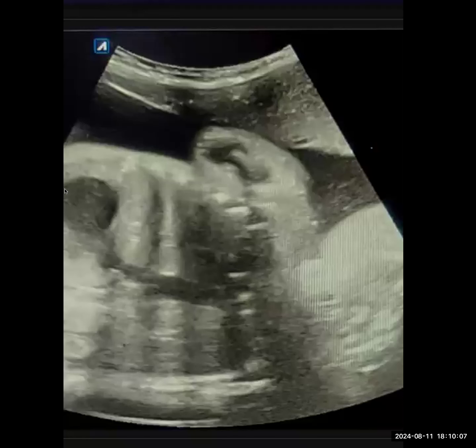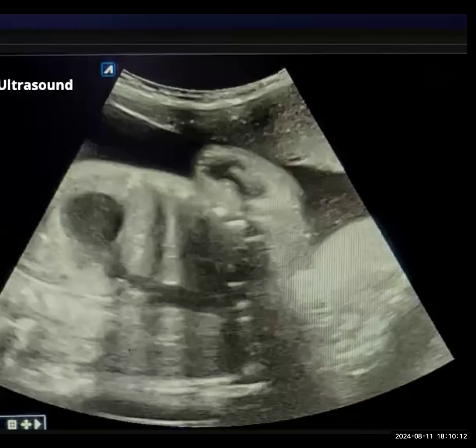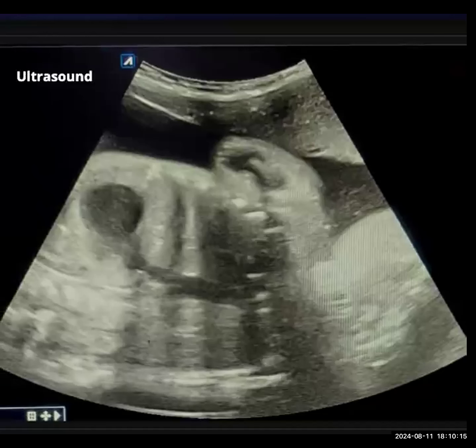This is your next case. Okay. Yeah, you can go ahead. So this is an ultrasound image done with the curvilinear probe. I think this is an antenatal ultrasound of a fetus because I can see a placenta along the anterior wall with some amniotic fluid around it. The fetus is at the left side, and the torso of the fetus is on the lower part, I think.